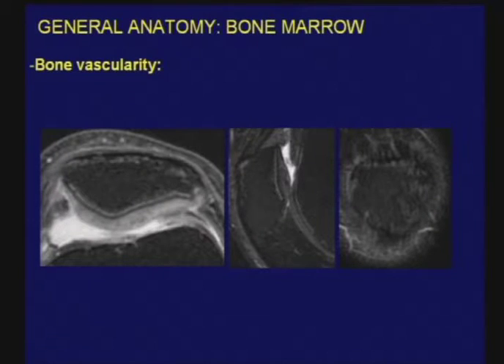One other point I would make as we look at the patella, shown in this particular slide, is the ability to see hypervascularity in the bone. Now, you'll see this in other bones about the knee, but it is generally most prominent in the patella, and it leads to a bone-within-bone appearance. You get this linear or spotted peripheral area of intermediate signal intensity, which you can see very nicely in the axial plane. You see it in the sagittal plane and coronal plane as well.